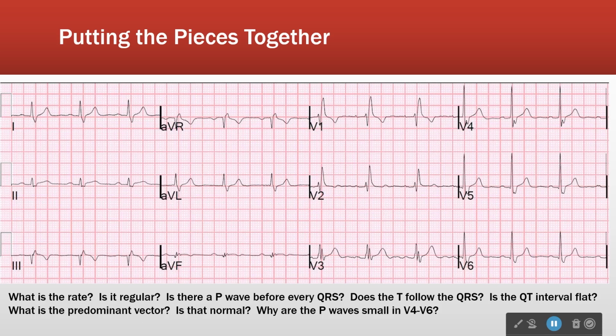So you can get low heart rates, particularly in very fit people. And remember, children have higher heart rates than adults do. The smaller the creature, the faster the heart rate. Your desert mouse ticks along at like 200 beats per minute, right? Because they're tiny. Big blue whale, probably like 50. Okay, so that's rate. Is it regular? Are the complexes about the same distance apart?